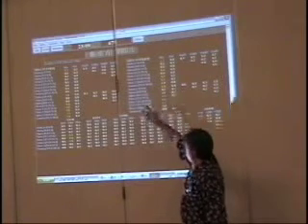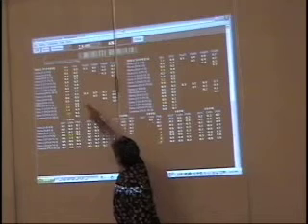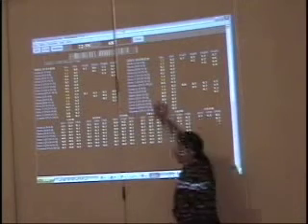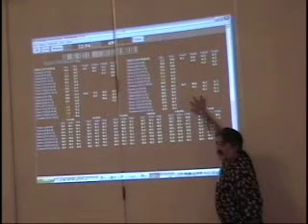F3. Yeah, the top one is F3. Here, these are all the absolute relative power ratios. The top is F3, the bottom is F4. Then we go over here, we have P3 and P4. Here, the top is P3, the bottom is P4.